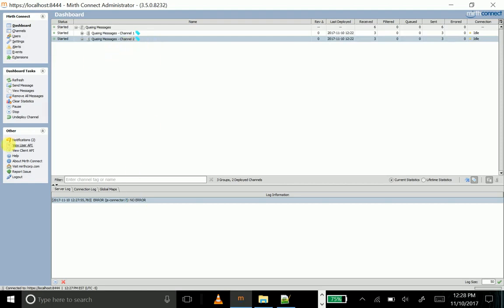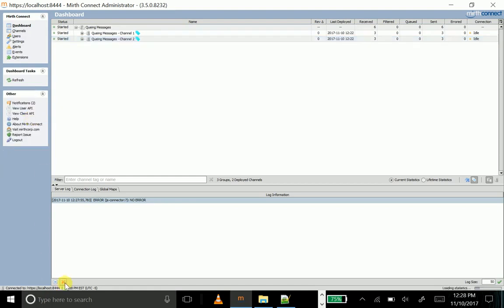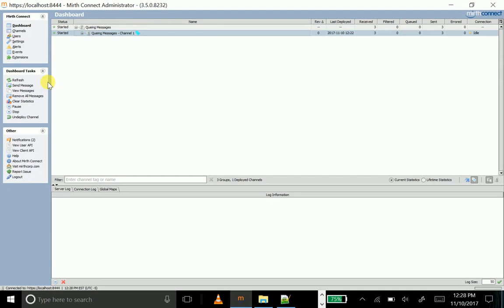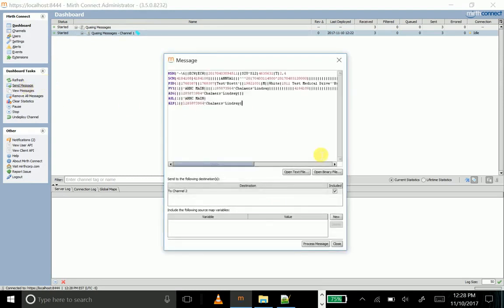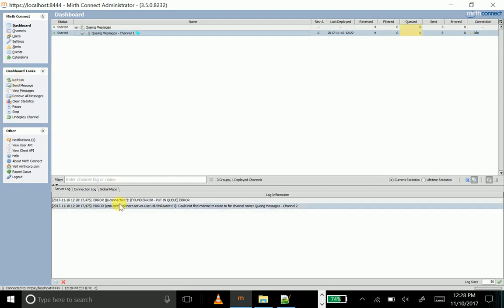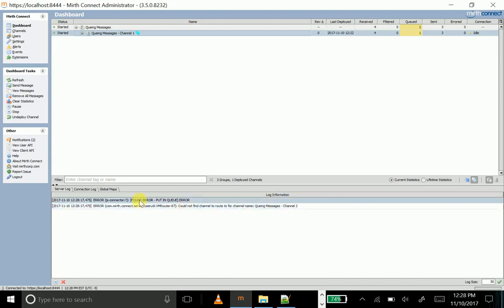Now let's undeploy it. Let's undeploy channel number 2. All right, so now we got channel number 1, and channel number 2 doesn't even exist. It's not even deployed. What happens now? Aha, same thing. Again, Mirth tells us there's a problem. There's a logger statement. Here's a queued message.